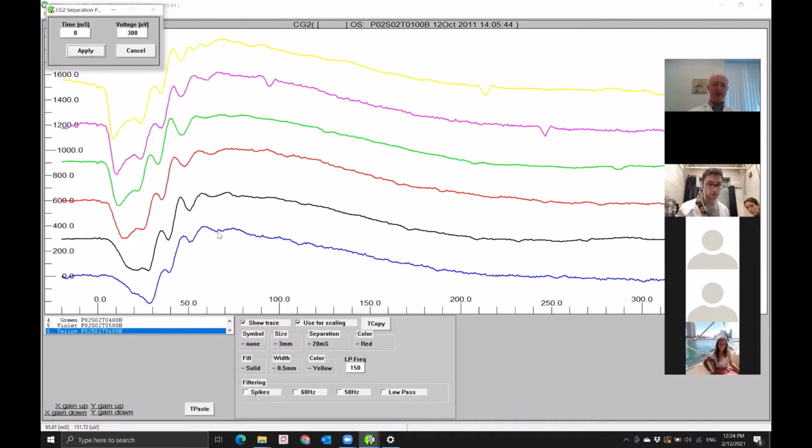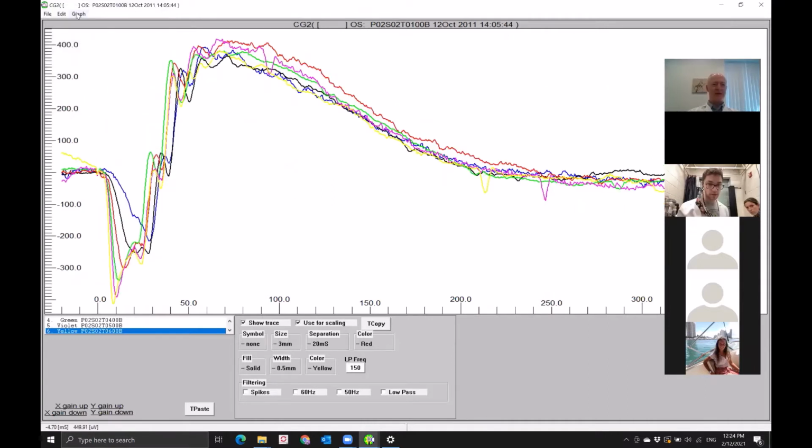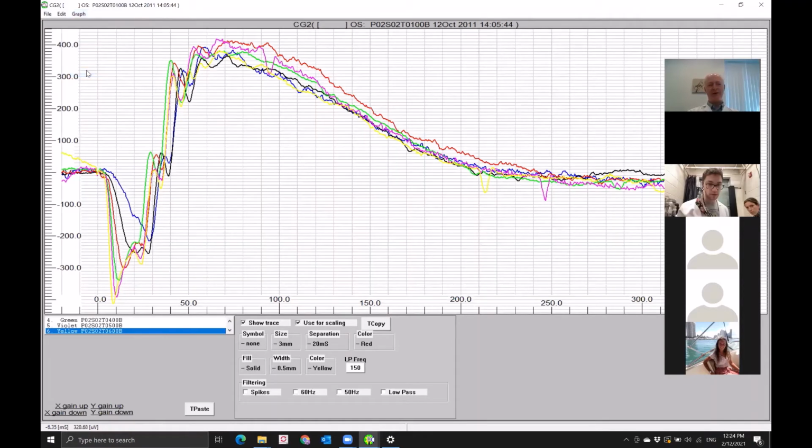Now you can see you got this interesting little waterfall, where you have the B wave, the first wave at the bottom, and the progression going up. So however you would like to do analysis, there's a variety of ways you can do that as well. Let me cancel on that, bring it back to where it was. We can also just show graph only. We can put graph lines in here.